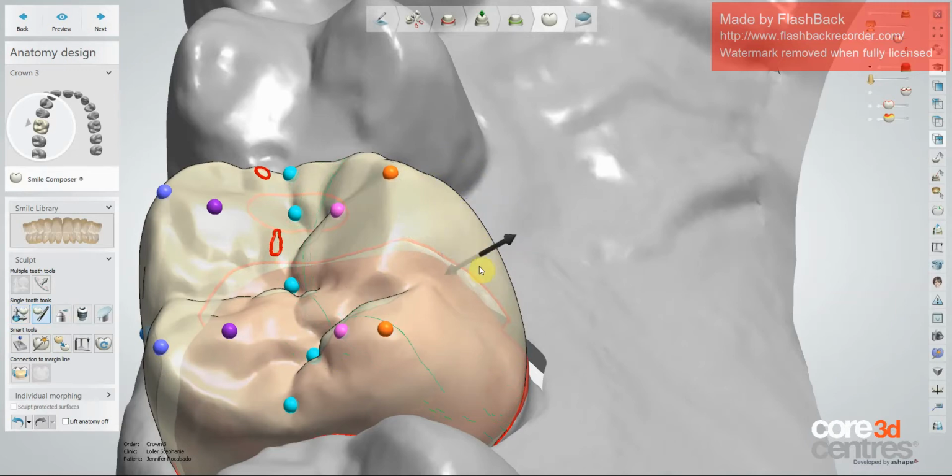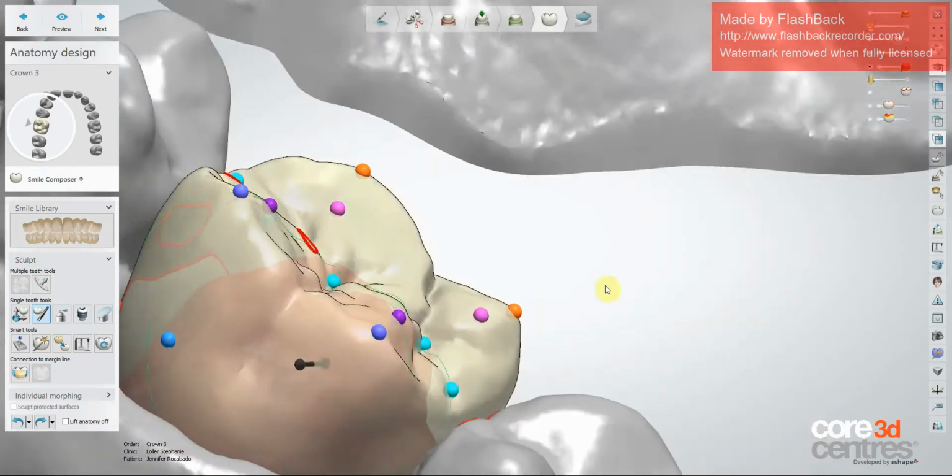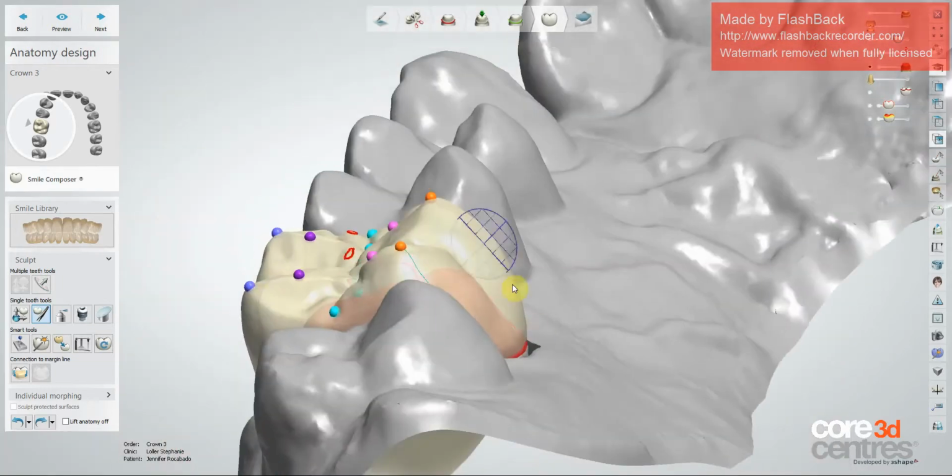Control button gives you this. Okay, this is how my world revolves around this tool, because it forces you into one plane versus this where you can make a mess real quick. It's a very rigid tool, but I like that because we want to keep things quick, fast, and efficient. This, you get in trouble real fast. This, you got one thing.